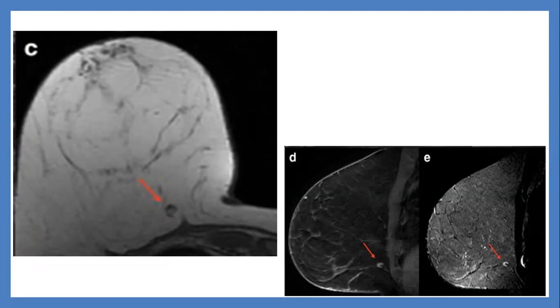On ultrasound, circumscribed, kidney shaped or lentiform, with a thin hypoechoic cortex, slightly lower compared to the adjacent fat lobules, smooth, uniform, less than 3 millimeters, and a central echogenic hilum equal to the fibroglandular tissue. You might see adjacent vessels or vessels entering the fatty hilum on Doppler.